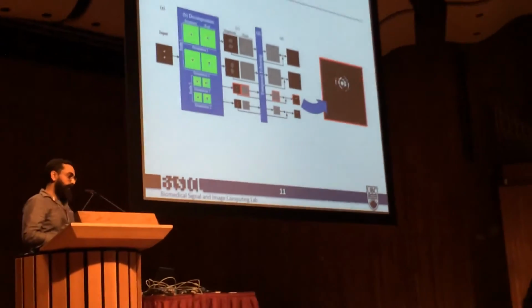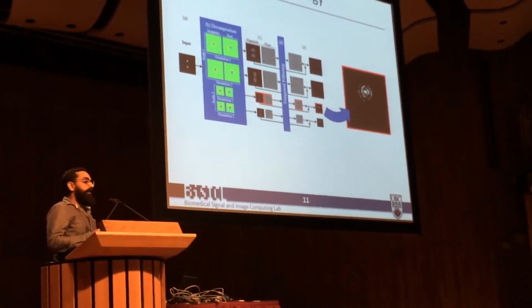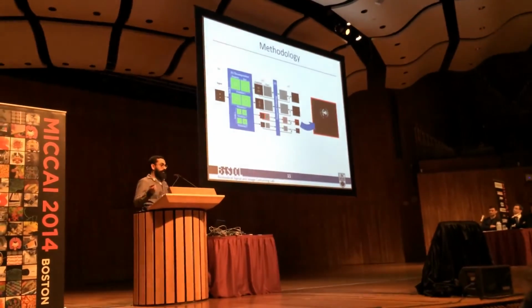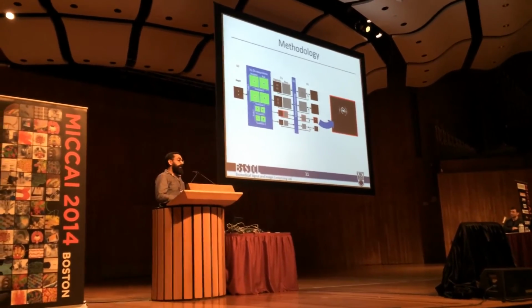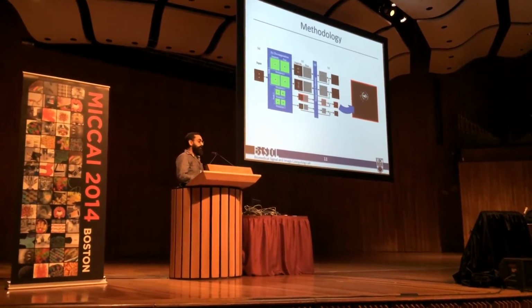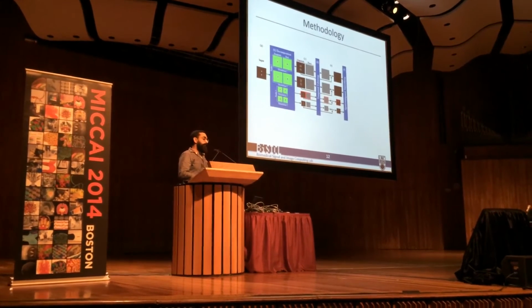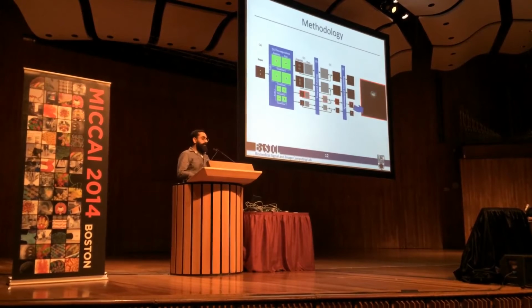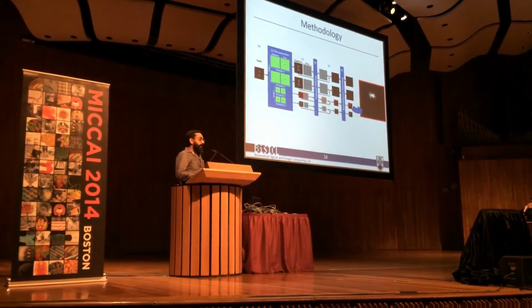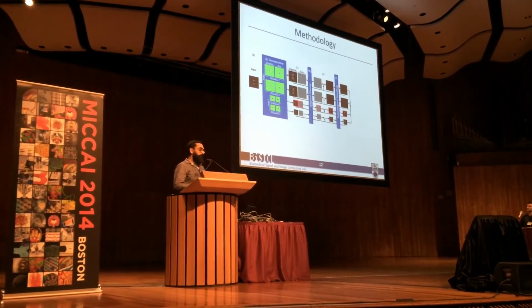And another important consideration at this point is in regards to the wrapped nature of local phase measurements, and this results in impulsive noise after the phase has been bandpassed. So to deal with this type of noise, we just apply a spatial temporal median filter, and the resulting outputs are then collapsed back and added together using a magnitude weighted averaging scheme.